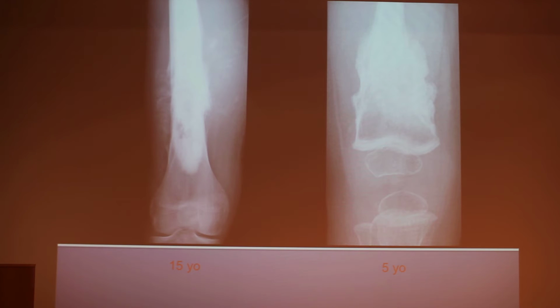Another pattern could be described for malignancies, which is osteoformation, like here in this example. Here you have two different patients with different lesions. One of them is benign. I just want to show you that it's not because you have bone formation. Bone formation doesn't always mean malignancy. So do you have an idea of which one is malignant? On the left, of course.